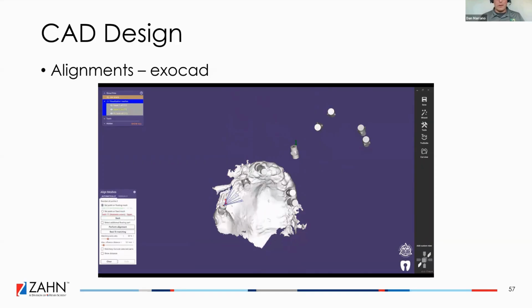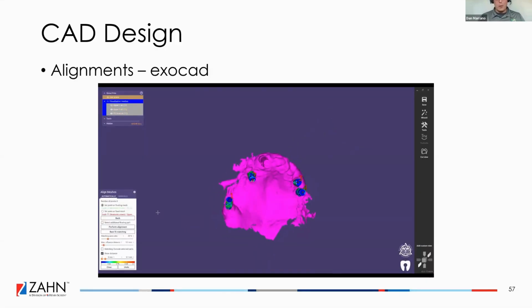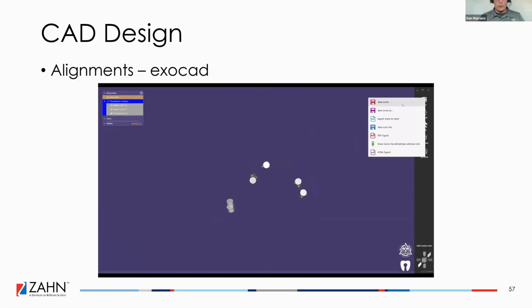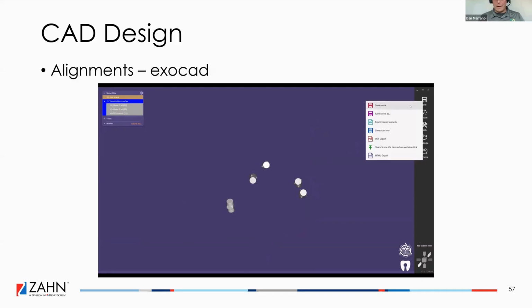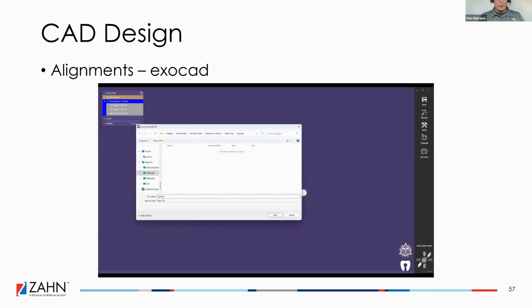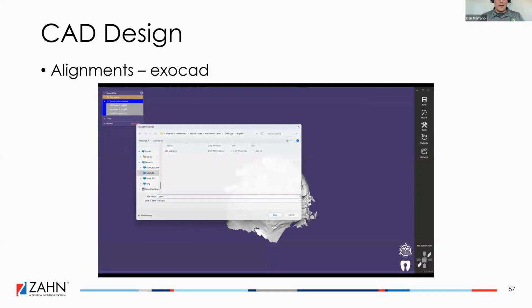Here's his photogrammetry scan. You notice here, and I like to have about 3. He did move. He changed that 1 MUA there, so it wasn't super gingival. And I saved the scene. That way, if we ever have to go back and get that, we don't have to go through all those alignments again. And then you just individually save these scans.